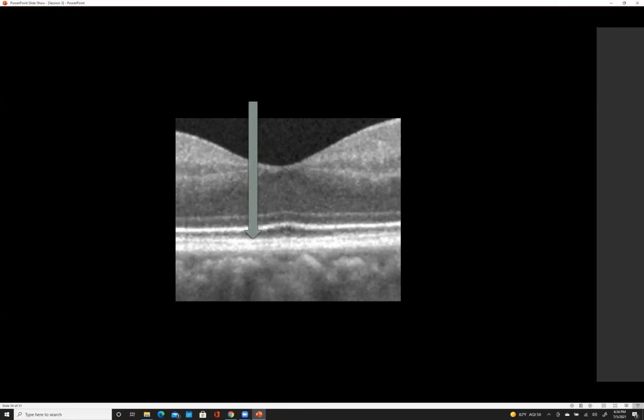So, going specifically, what is that next line? Moving to the interdigitation layer. Right. And what is that layer? These are the fimbriae or apical processes that are connecting with the photoreceptors. Apical processes of what? What is the apical processes of? Which cell? Of the Mueller cell?